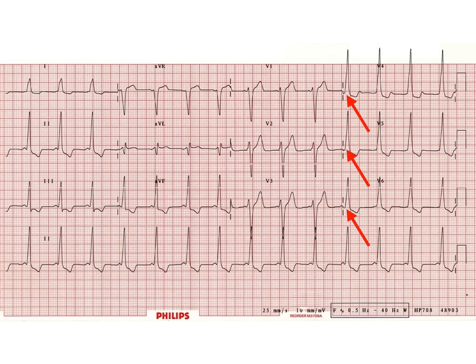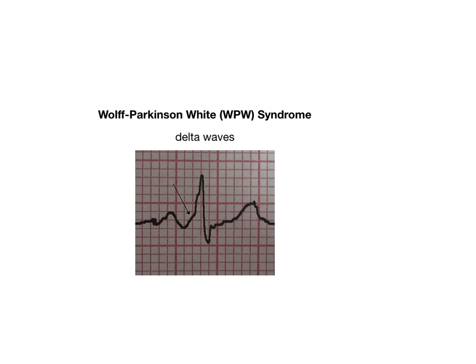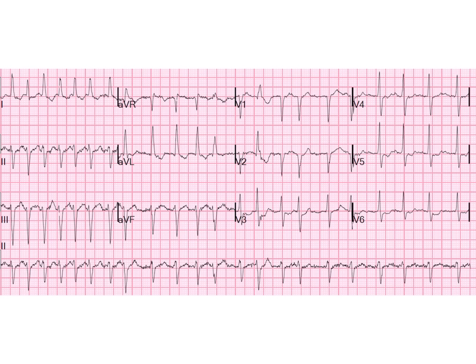So what is the point of doing the methodical, unnecessary waste of time method that you're seeing in all these other YouTube videos, okay, guys? Look for the pathological findings and answer the question. It's that simple. WPW has the delta wave that upslants. Done, moving on. What do you see here?